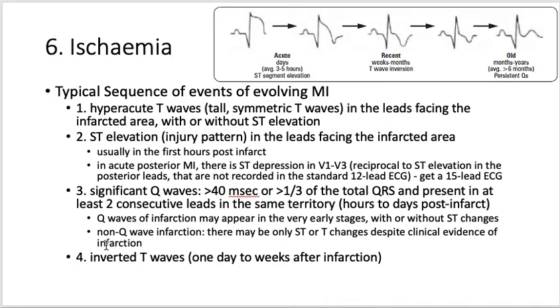And then quickly go through the sequence of the ischemic changes that occur when someone is having a myocardial infarction. So we can see the visualization of the changes up in the top right row there as we go through the ST changes and then the Q waves that may occur. I just wanted to touch on this so that when you're looking at an ECG, you can see where these changes help to point out, along with the detailed history of course, if it's any new or any old ischemia that may be true.